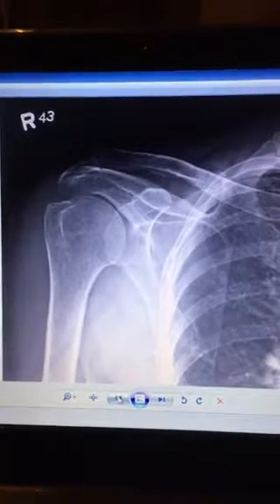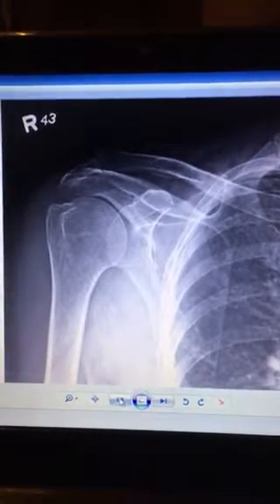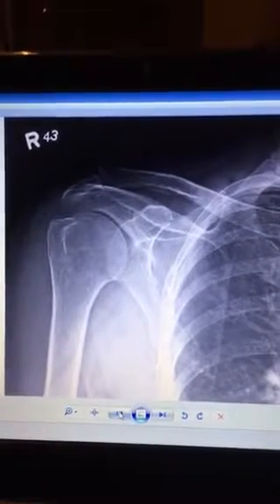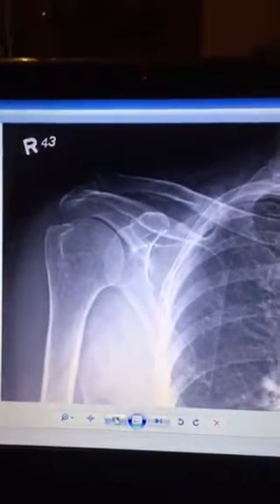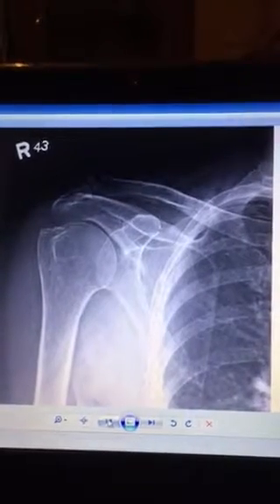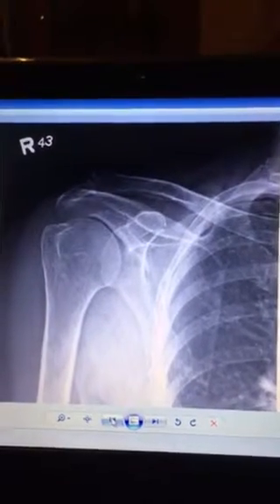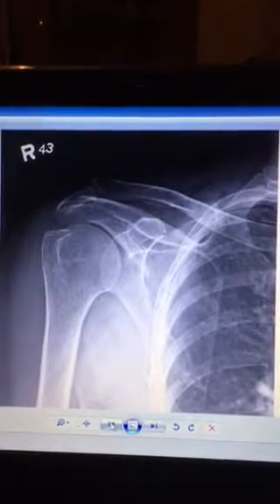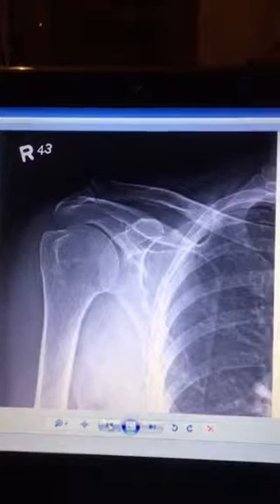For a good X-ray, we always should see collimation around the area of X-rays. In this case, my first image is an AP shoulder with the external rotation.